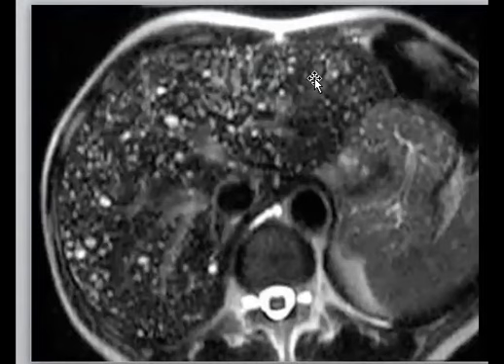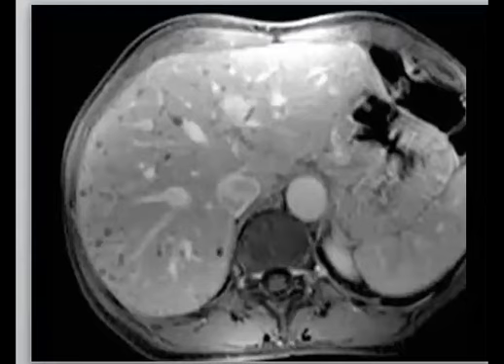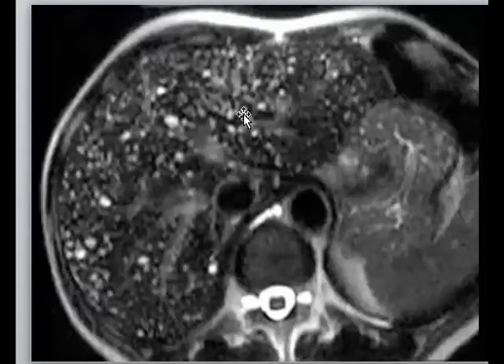You should have the contrast to be sure that there is no enhancement after injection. So on post-contrast T1 fat-sat you don't have any contrast in this lesion, then you are thinking that maybe it is a cyst or hamartoma. With this appearance, you can go that it is a cyst.